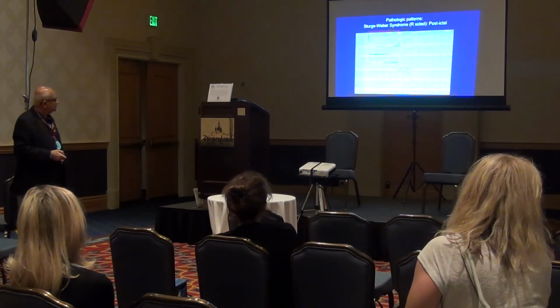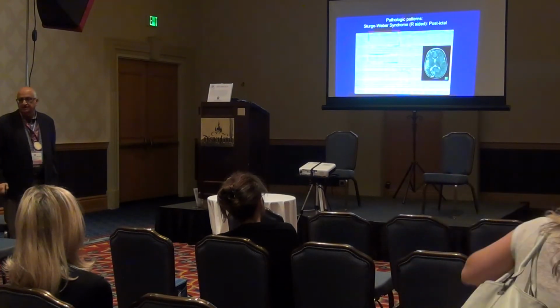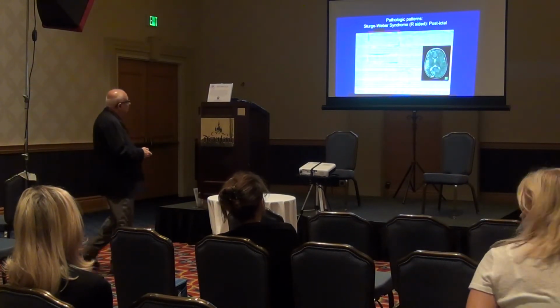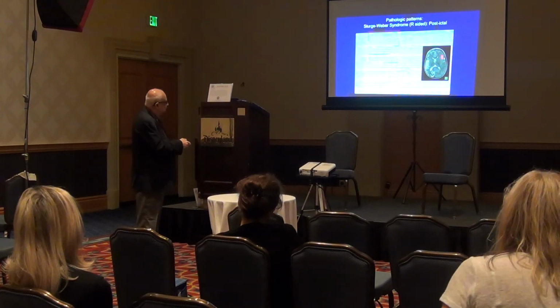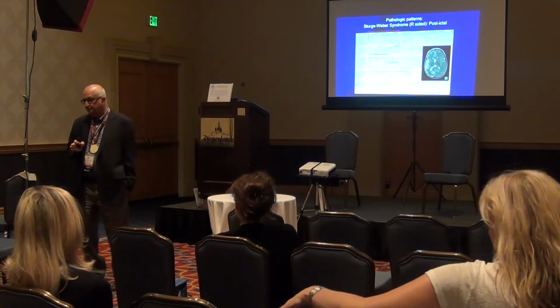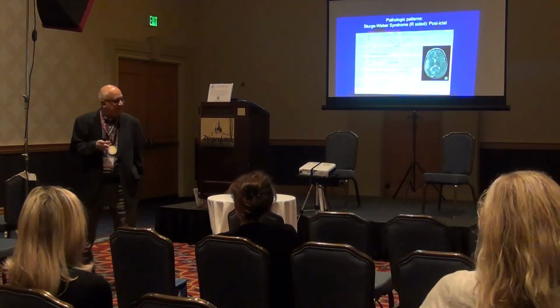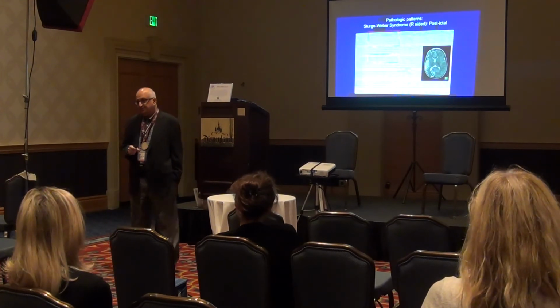And what happens in this case is, there's a good MRI. In the MRI, what I'm trying to show you is this side, this is the left side. Every time they show you MRI, they try to confuse you. What you see on the right side is actually the left side.